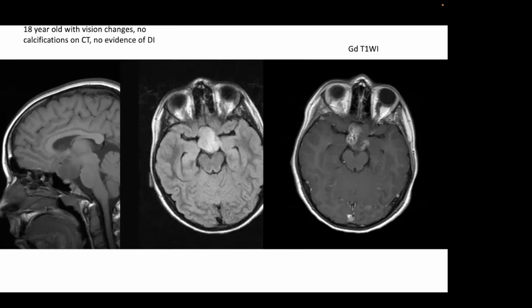Optic nerve pathology. Optic nerve, excellent. So optic nerve disease, and you want to know if the patient has neurofibromatosis, because we know that optic gliomas are more common in patients with neurofibromatosis. But of course, you can also see optic gliomas in patients who do not have NF1. What about a hypothalamic hamartoma? Could this be a hamartoma?